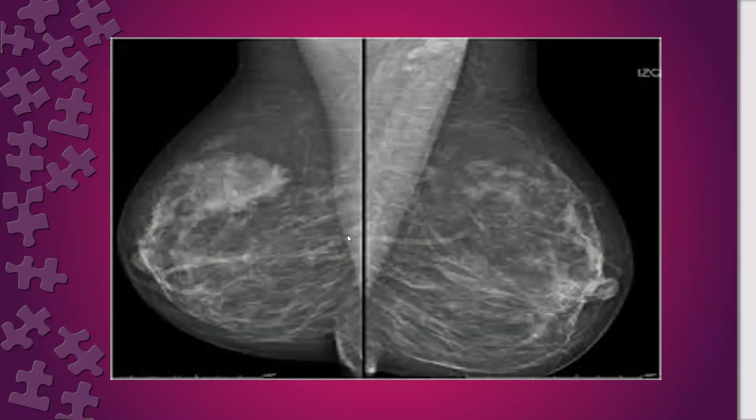One thing, but there is something more specific. What about the shape of the pectoralis? What do you expect the border of the pectoralis to be? It should be either straight or convex, but it should not be concave. Here it is concave.